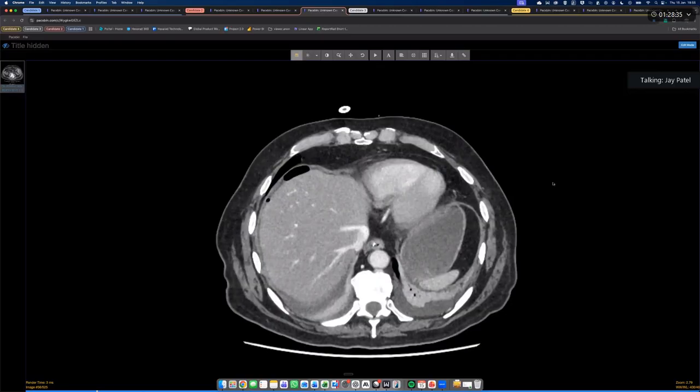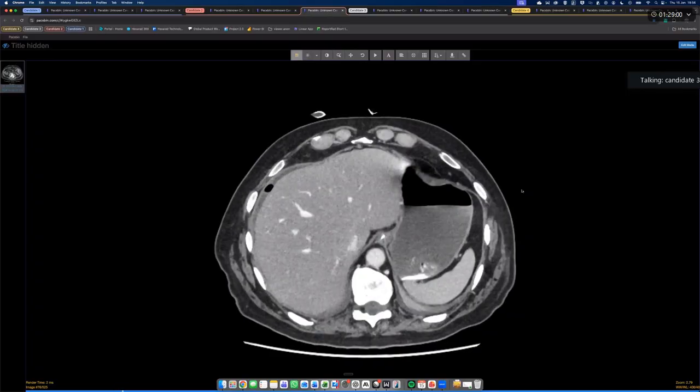Last case for you. You're doing very well. So this is a post-contrast CT abdomen and pelvis. Again, this patient is day 6 post-laparotomy for an acute colitis, and they're presenting with worsening inflammatory markers. Go ahead. So I've been presented with axial post-contrast images.